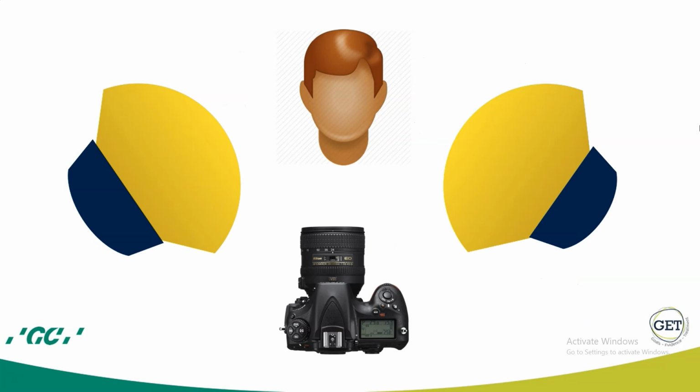The principles are almost the same for extraoral photography. Two paraflashes should be used bilaterally to have a good extraoral photo. In extraoral photographs, you may either use a black background or a white background or any other color you would like.